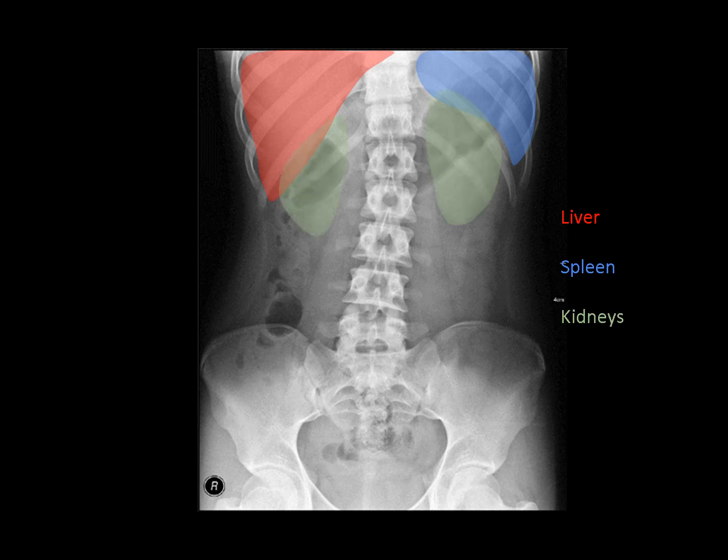So we talked about the kidneys. Moving more inferiorly, we can see there's a line or edge extending down the entire abdomen here, and then also on the other side. And what that is, it's outlining the edge of the psoas muscles, which are originating along the thoracolumbar spine and extending downwards toward the pelvis to eventually insert on your femora bilaterally. And those are going to be powerful hip flexors that we can often see on radiograph.